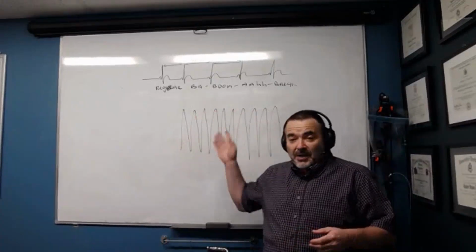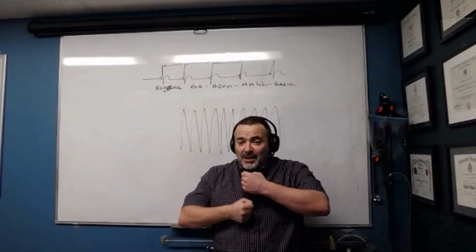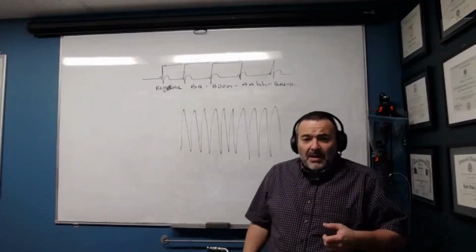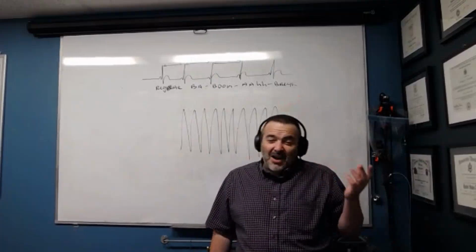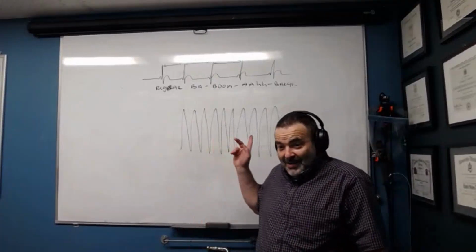Is this regular? Oh yeah, you betcha. It's pretty regular. Boom, boom, boom, boom. That's just the bottom section of the heart pumping out of control. 300 beats per minute. Not good. We're supposed to be somewhere between 60 to 80, maybe shooting up towards 100 when you're a little bit stressed out and stuff like that. But if you're a normal adult, it ain't 300.